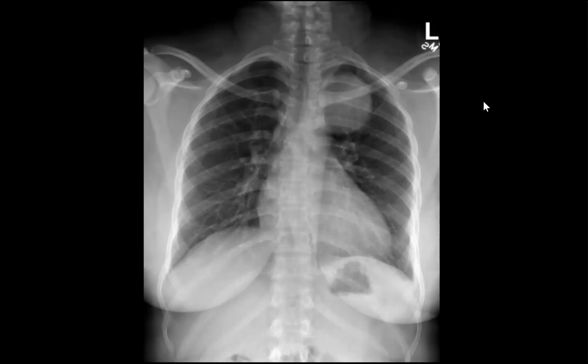I'm presented with a chest X-ray frontal projection for a skeletally mature patient. The striking abnormality is a well-defined opacity seen projected over the superior mediastinum. Its lateral border is seen delineated and well-defined, and its medial border merged with the mediastinum. The opacity extends above the clavicle, making a negative cervicothoracic sign, which denotes it's a posterior mediastinal mass.